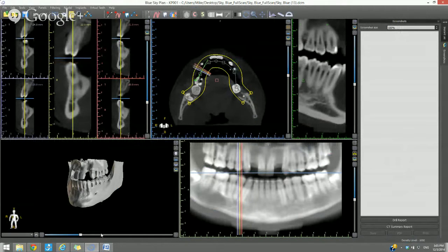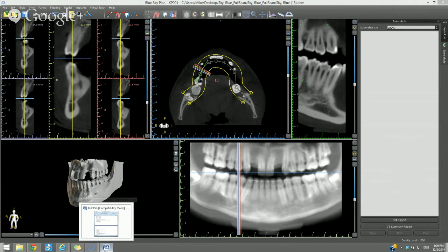Some of the topics that we're going to be discussing and going over are DICOM images, what they are and how to load them into the software, the different views that we're currently viewing on the screen, the panoramic curve, the 3D view, how to manipulate the different views using your mouse functionality, placing implants, and different other tools for measurements and functionality that's in the software. So we're going to get started. Again, if you have questions, put them into the QA box and I'll address them as we go along. Otherwise, let's go.